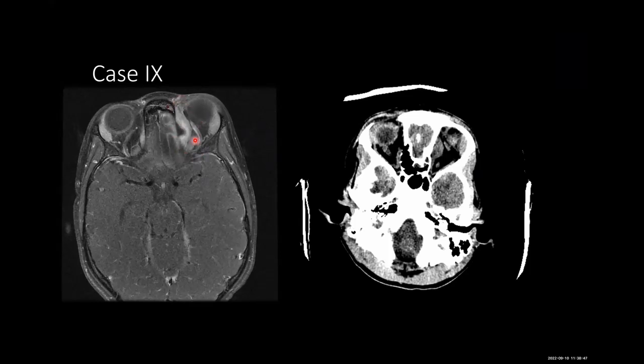Okay, I hope this is clear. This collection, subperiosteum, and goes, this can go everywhere. And here it is the inflammation, the sinusitis.